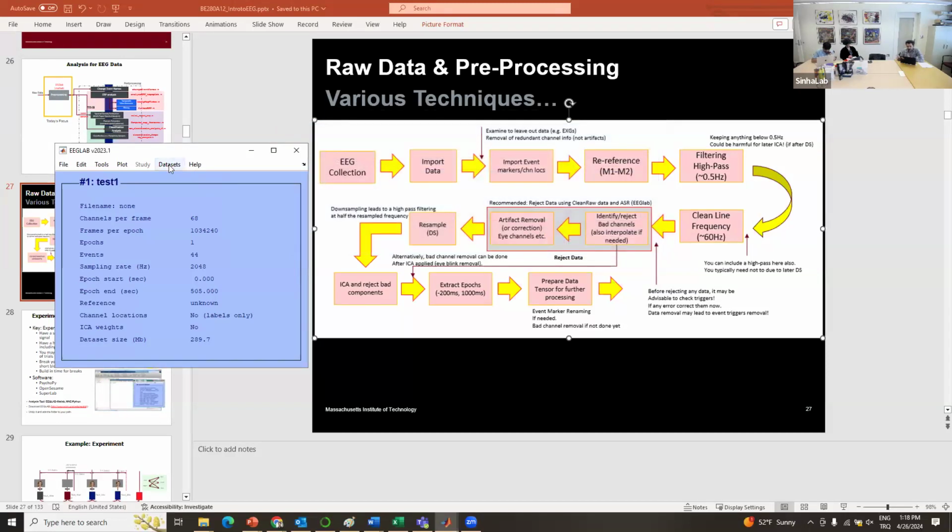Overwriting means if you click on the data set, you will see that there's only one copy, okay? Because I've overwritten every one of them. But you don't have to do this, and as I'll show you, as you go step by step in the pre-processing pipeline, you will realize that for some steps you may want to store the data as two different copies, so you can have different branches in your pre-processing.